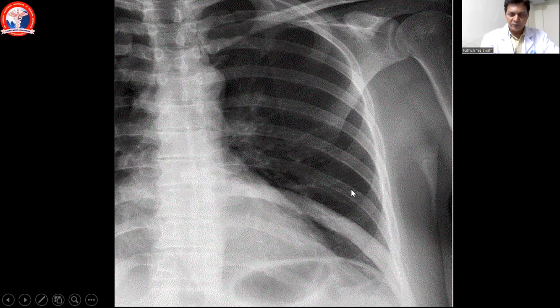We can see the upper rib and lower rib. Related to that, it is showing some expansion, that is enlargement as well as diffuse sclerotic changes. So what we get to see here is a single rib involved. This is a case of fibrous dysplasia, where the rib is showing expansion and increased density.